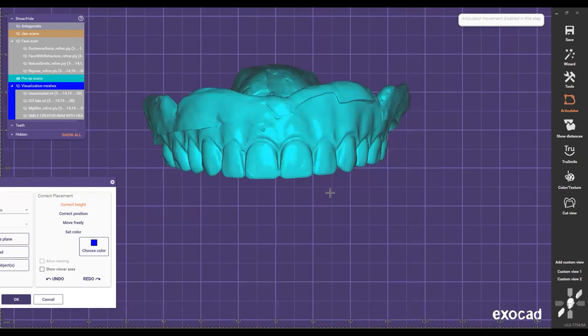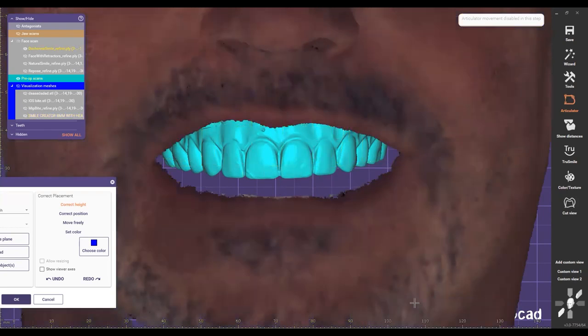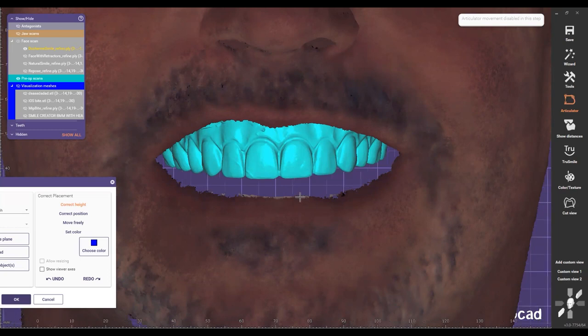We don't know why. And here I just did this and I know why: these teeth were too long because they were not properly set in the face. They were just set up on a stone model, and that's it. So, hoping that it's going to look good in the mouth, but I can see right away that it doesn't look good. But having the facial scan, we can nail any case. Veneers, we have a workflow for veneers, overdentures, dentures, crown and bridge, all-on cases. We have protocols for how to do these cases. So that's how confident we feel doing these cases.